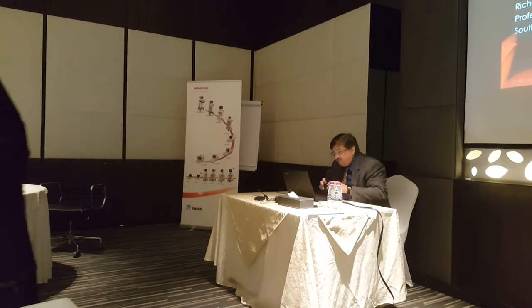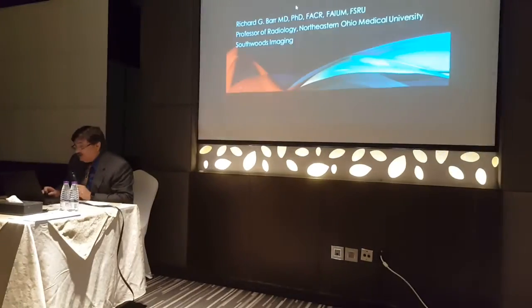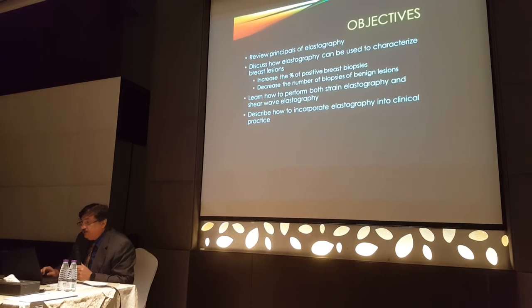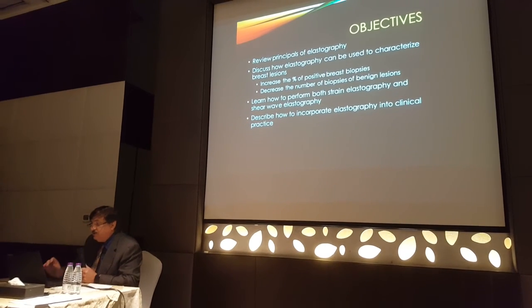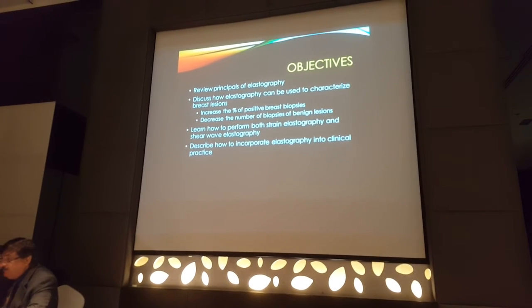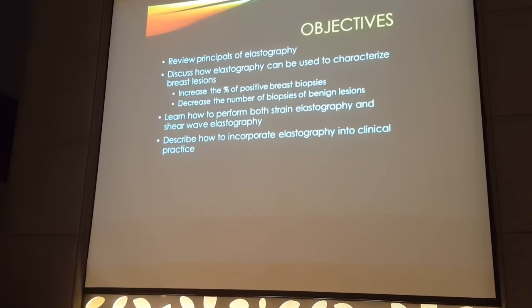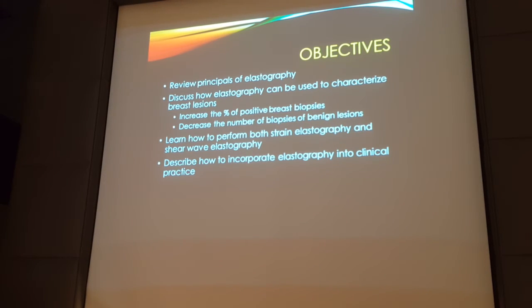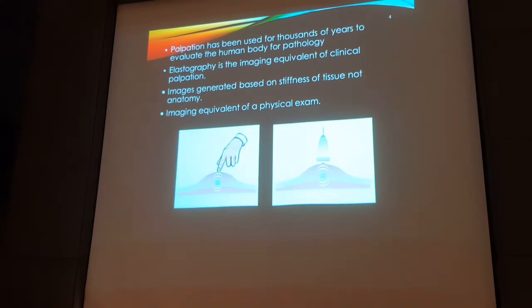Thank you. I'm going to go kind of fast in the first part. We've been doing breast elastography for about 20 years, so I'd like to go over the principles and discuss how elastography can be used to characterize breast lesions. Since we've been doing this, we've had a marked increase in the amount of positive breast biopsies because we're decreasing the number of biopsies of benign lesions. Learn how to perform strain elastography and shear wave elastography, and describe how to incorporate elastography into clinical practice.